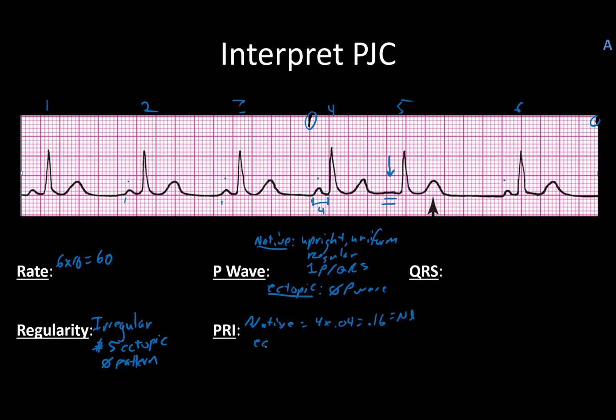And for our ectopic, no P equals no PRI.